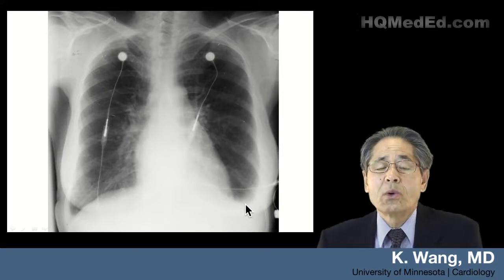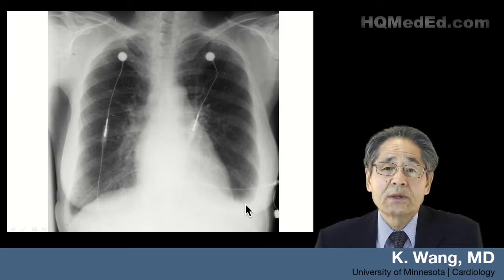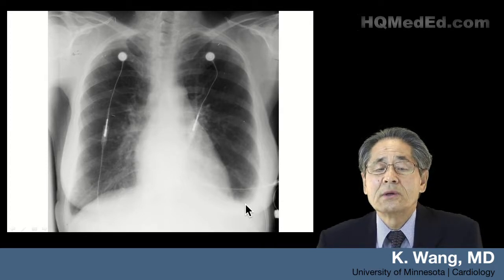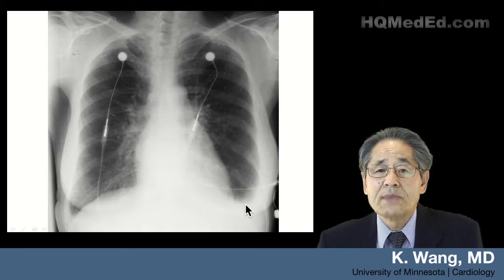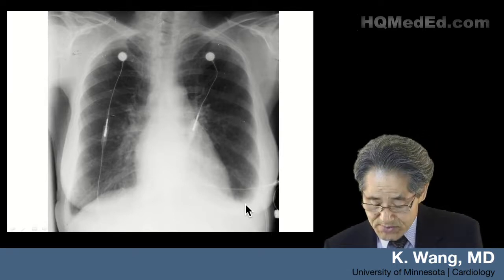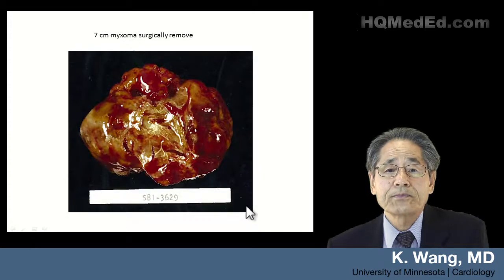So remember, we order an echocardiogram when I don't know what I'm dealing with. But here I was able to order an echocardiogram with the rule out left atrial myxoma. And indeed, the echo showed the left atrial myxoma, and the patient was taken to the operating room.